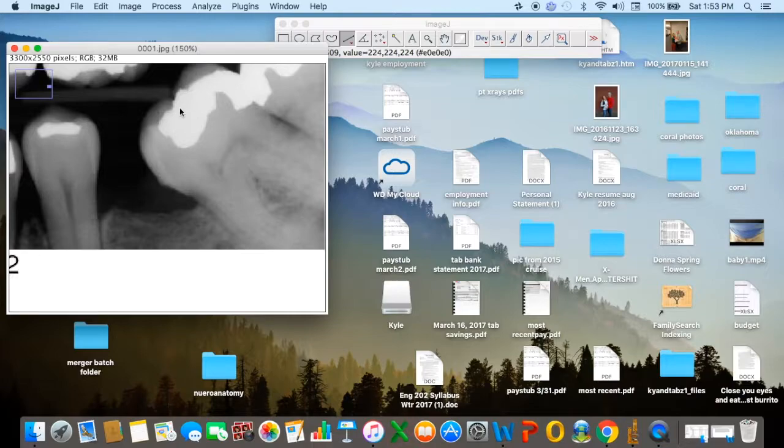I can make a quick note about this one. The operational definition, I believe, somewhat addresses this, but when we have teeth that are at a different angle, once again, we're going to attempt to go perpendicular to the surface of the tooth as best we can. So our measurement would be somewhere in there.